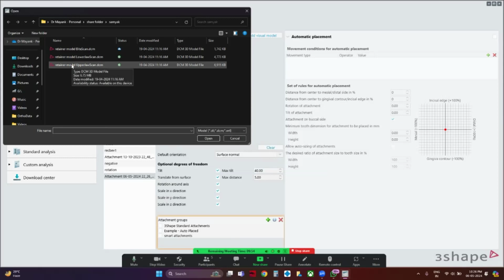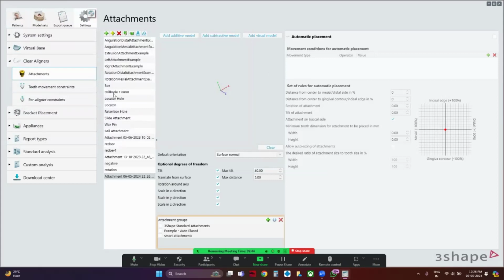Woh Zoom ka woh hai, it only allows 40 minutes on a free Zoom account. So you browse to wherever the attachment that I am going to send you is, and then you add it into this, and it automatically saves, and you save it as whatever you want, like new or rounded, whatever you want. I call it rectangular. Okay. Us tarike se you save it like that.